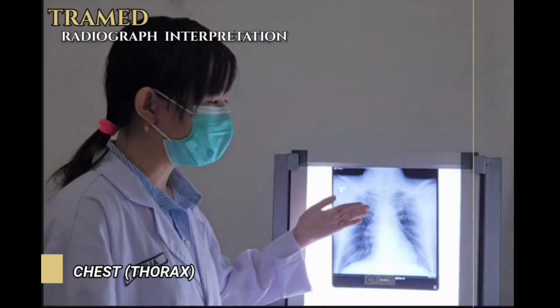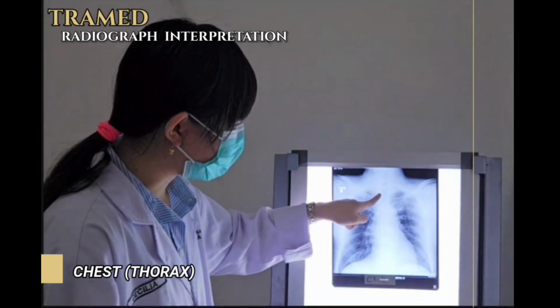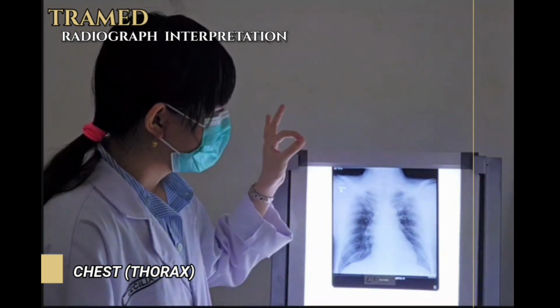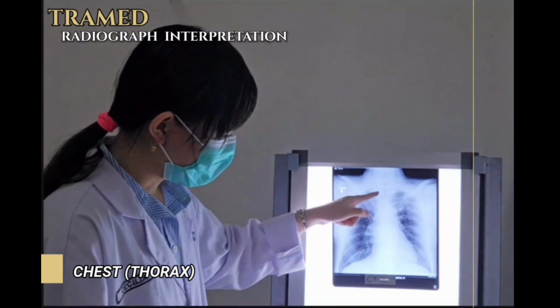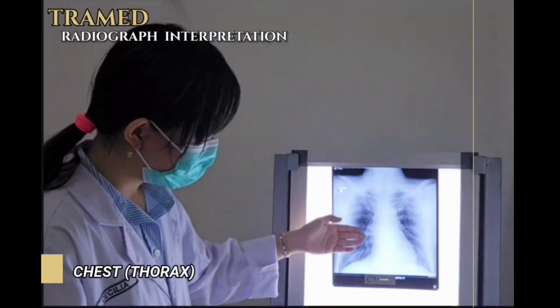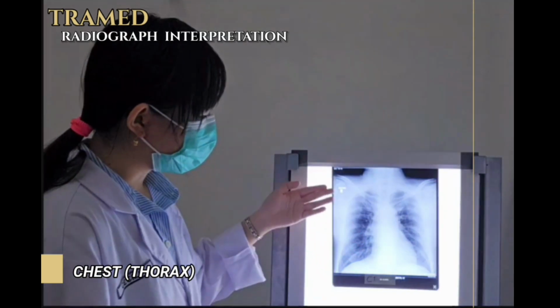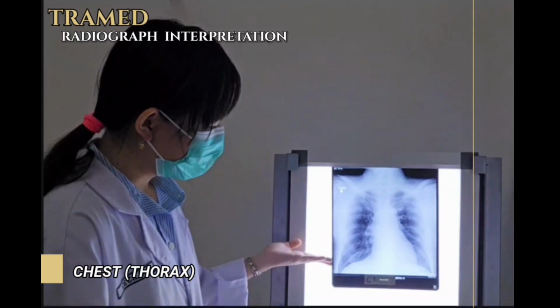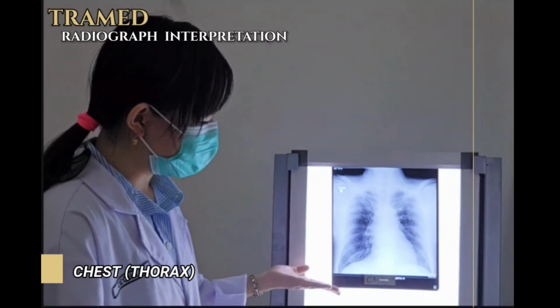And after that, the trachea is located in the midline position. We can look at this spot. It's a little bit gray, not too white in this spot. And after that, there is the hilum in this spot. It's not thickened. And for the pulmonary vascular marking, it's normal. And for the parenchyma, there is no infiltrate, nodulus, fibrosis, cavities or other lesion.